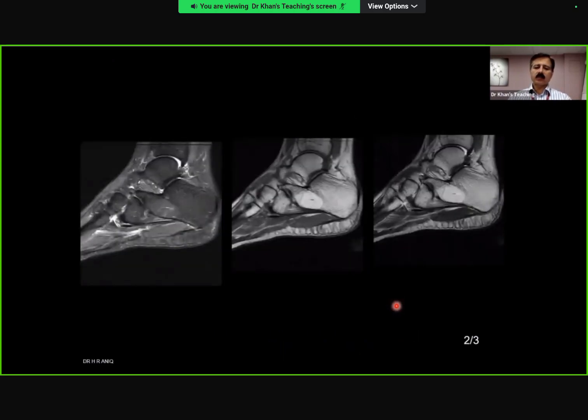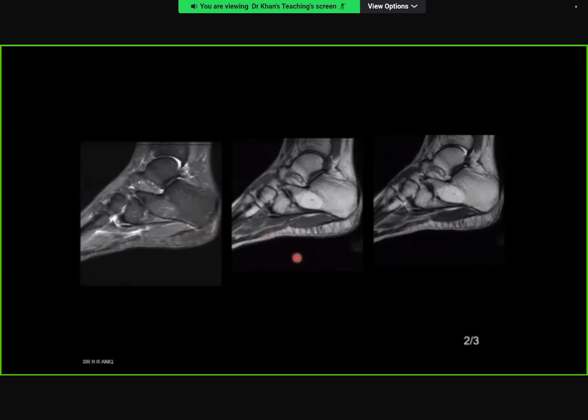And this is an MR. What is your diagnosis? Just give me the diagnosis. Compare this with this. It's a lipoma. Lipoma. In the lipoma, there might be a central calcification, which appears as low signal here.